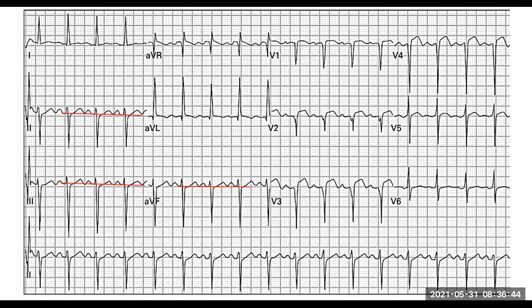And we look at the same thing there, as compared to this one. Let's put this one. Does that make a bit more sense now? Can you see the difference? Okay, so that's an ST elevation. That is nothing. As compared to it, let's say from here we were to get something that looked like that. That would be an ST depression, for example. So in other words, imagine we've erased that line. We've got something that's an ST depression. Okay, all right, let's clear that.